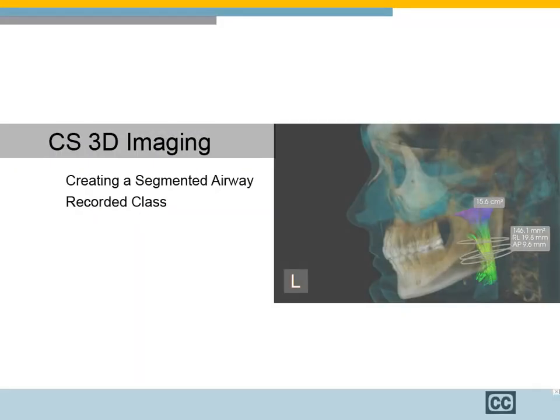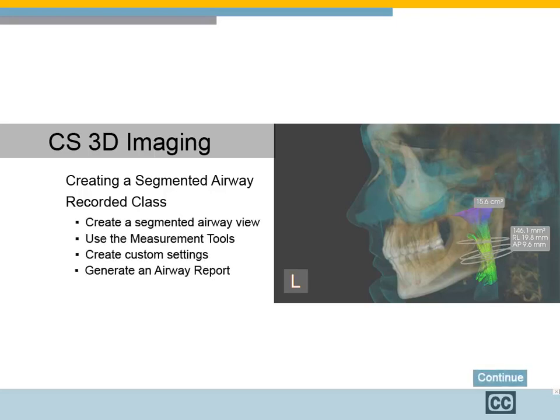CS3D Imaging, Creating a Segmented Airway Recorded Class. This recorded class is designed for ENT, sleep apnea, and orthodontic team members. It provides the workflow to create a segmented airway view with distance and volumetric measurements.